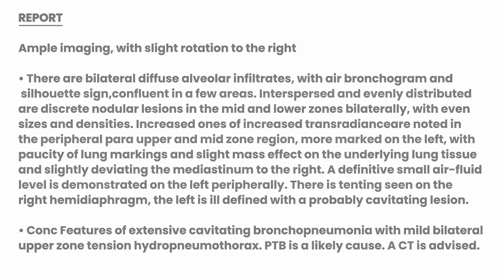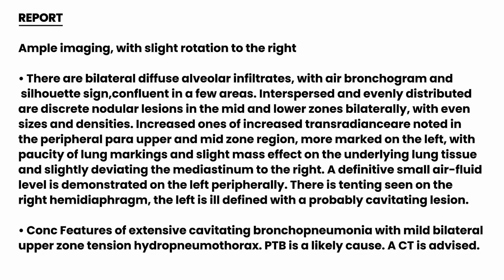So what would the report look like? A report sample is there. It's not the gold standard, but it's a proposed report. You could modify it accordingly. And this one just says there is an image with slight rotation to the right.